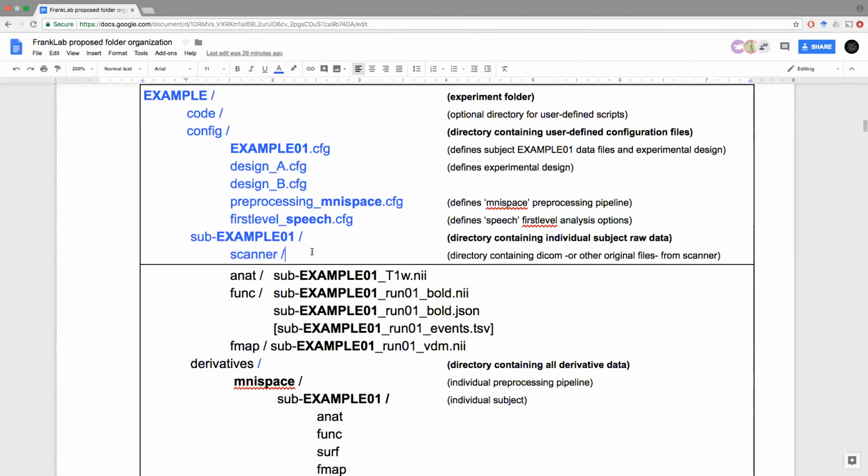Right, exactly. So, I mean, we could have a link within the scanner folder or something. The scanner is where we put everything that is kind of like the raw data that we enter to our pipeline. So it would make sense to put a link here that points to the FreeSurfer folder, perhaps for that subject. Or we could have a raw copy, but I think I probably like having a link better, though this is totally up to you. What do you think makes the most sense?